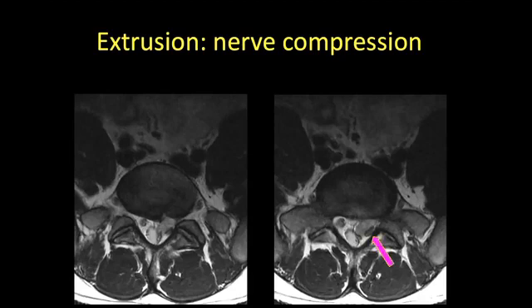So here we're seeing this L5-S1 left subarticular zone extrusion compressing the traversing left S1 nerve, basically the axillary sleeve, and it's compressing it against the facet joint. So it's not simply a matter of compression, but there are those inflammatory mediators that we mentioned that are then expressed here, and then this contributes to radicular pain.